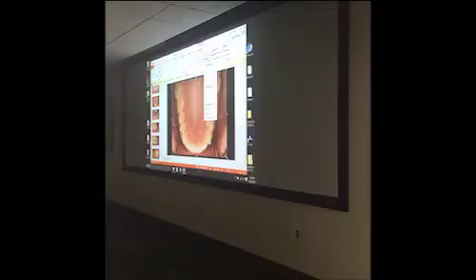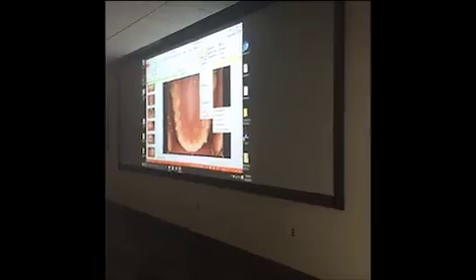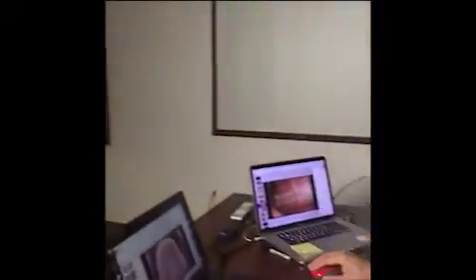Where's my rotate? I'm sorry, rotate. Sorry. Find align. If you find align, you always find rotate. The new version, they split them. It used to be under align. You find rotate. Go to flip vertical.